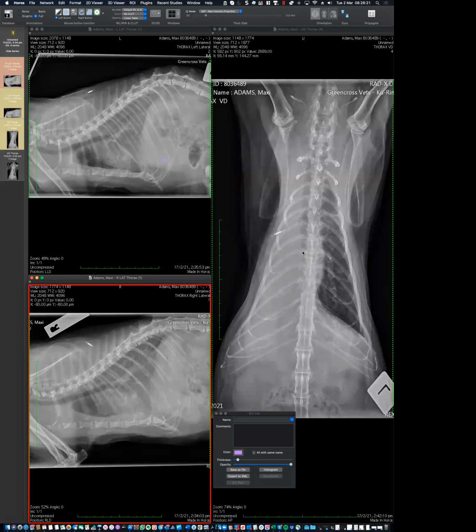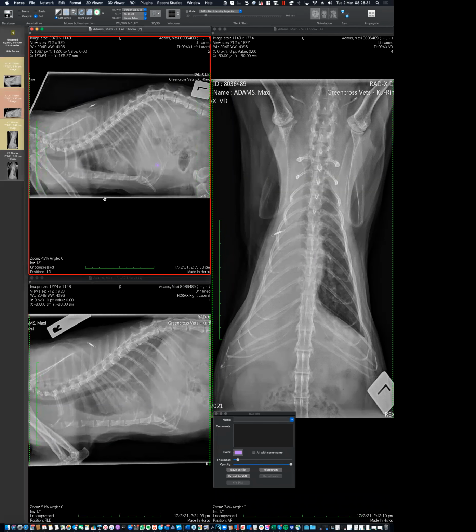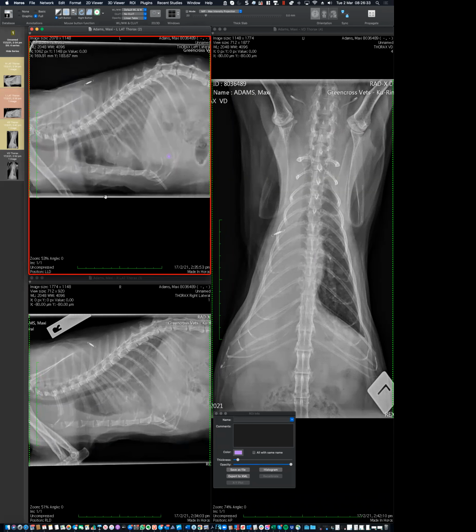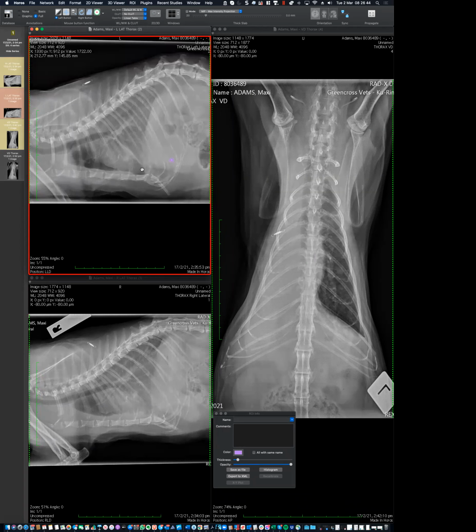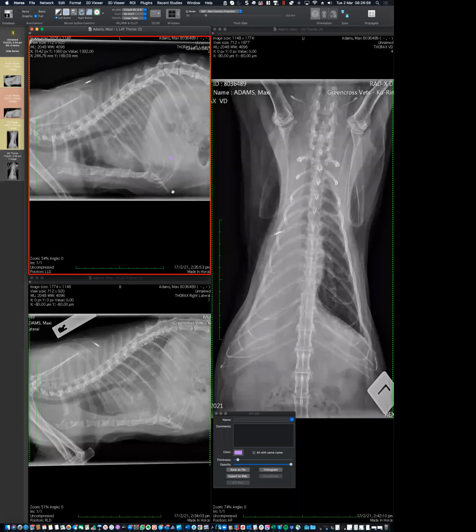When you're looking at the left lateral, I feel like you should see more opacity because you don't have an aerated lung. But it looks like in both laterals you can see a similar amount of air in the chest. So it looks like you must be just aerating the left lung in both laterals. But I thought it would look different when you are lying on the affected side compared to the unaffected side. But they look so similar, I can't explain the mismatch.